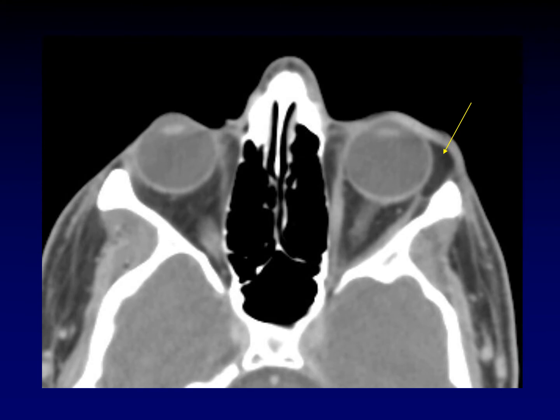You might be inclined, looking at this image, to say that there is a lipoma of the orbit. This lesion is purely fat density and well circumscribed. It looks just like a lipoma. If you are about to say lipoma for a lesion anywhere near the orbit, stop yourself and instead call it an orbital dermoid. Orbital dermoids look just like lipomas except that they're in the orbit.